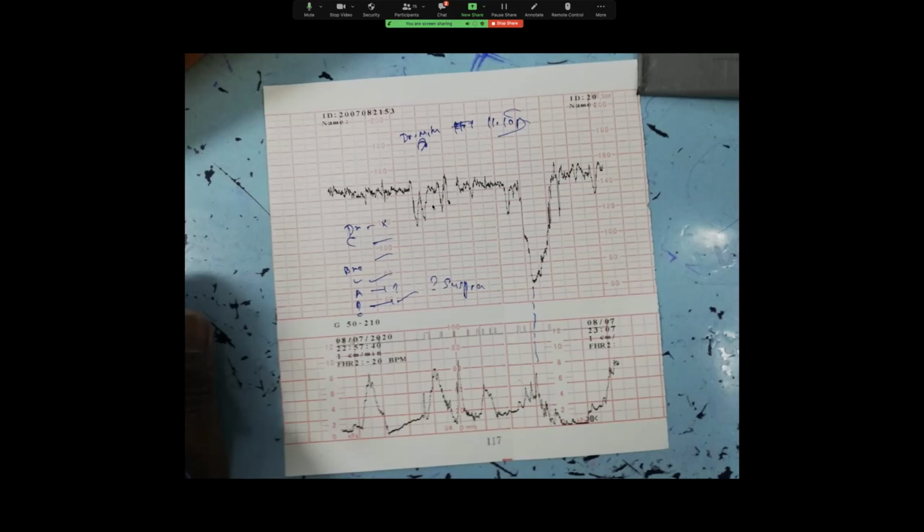But remember, even if these late decelerations go on for 30 minutes or more, then only it becomes what? An abnormal feature, and therefore it becomes a pathological CTG. So here we have just a single late deceleration. However, here we have a normal baseline and a normal baseline variability with a single late deceleration. Are we worried yet? No.